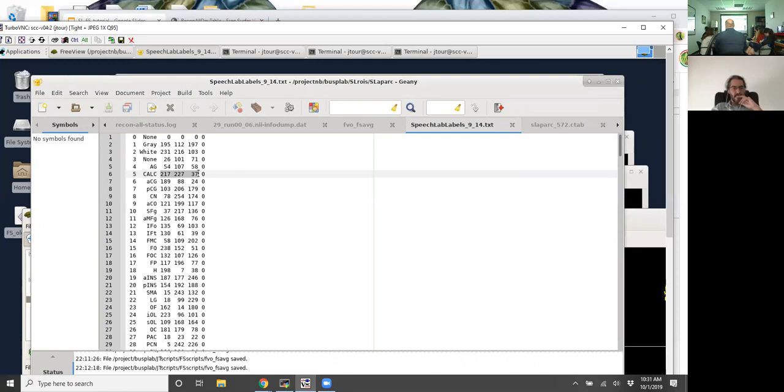That's the value of the region in the annotation file. It's not three different numbers. They get something like R plus 2 times G plus the square of B. I don't know if it's exactly that, but it's something like that. So they come up with some giant number.